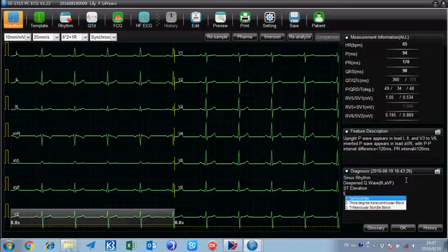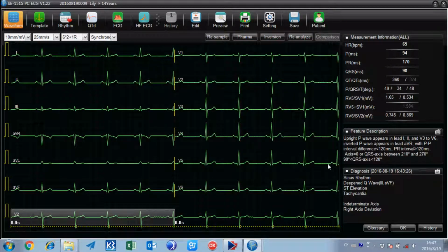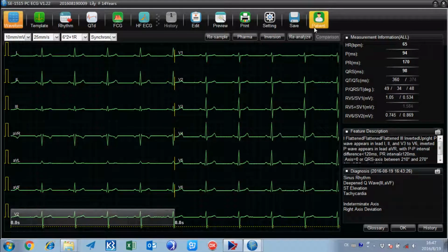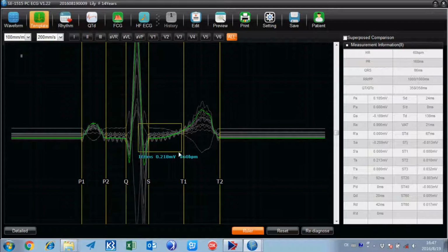Associating input and shortcut keyboards streamlines the workflow of the conclusion modifications. Meanwhile, you may also press the Reanalyze button to regain the auto-conclusion. ECG average templates and rhythm waves can be checked in Average Templates and Rhythm options respectively.